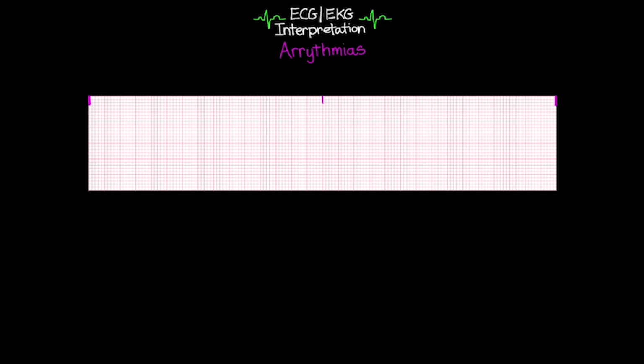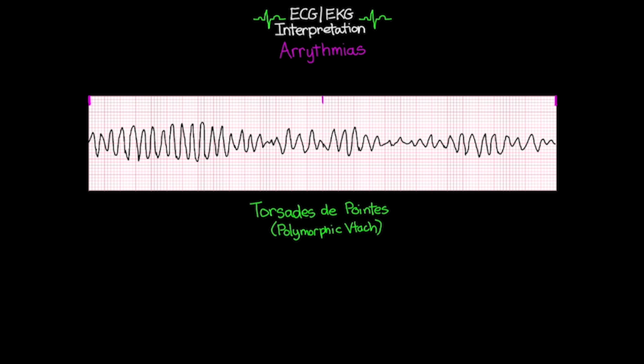Now, before we move to that next ventricular rhythm, I do want to show another variation of a different kind of VTAC, and this is something that we call torsades, which is essentially our polymorphic VTAC. The reason we call this polymorphic is because the origination of that irritated ventricular signal is moving around throughout the heart and not coming from the same place.